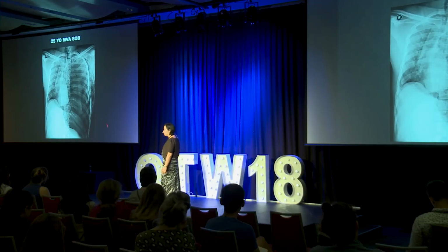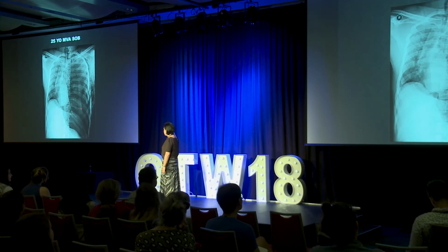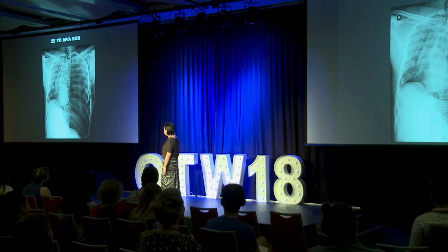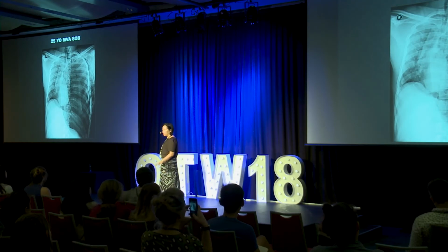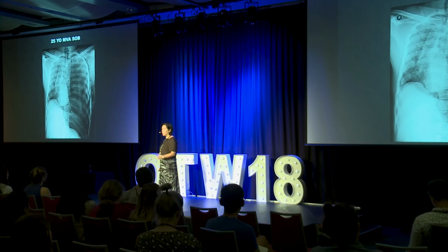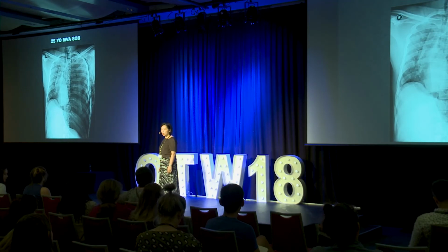There's quite a lot of volume expansion on that left hemithorax. And especially in such an extensive trauma, you want to really look at the aortic arch to see whether you can see it, because you want to make sure there's no vascular injury. If you've got blurring or poor visualization of the aortic arch, you probably need to do a CT to make sure there's no aortic dissection or transection or other aortic hematoma. Okay.